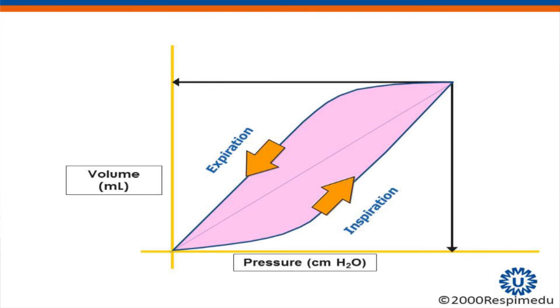This is what I told just, the point where your alveoli are going to open. This is the point where pressure starts, more pressure. And here air is going into the alveoli. And here you can see the loop as we normally see it, with some PEEP. Let's say this PEEP is 5 or 10, then your loop starts here.